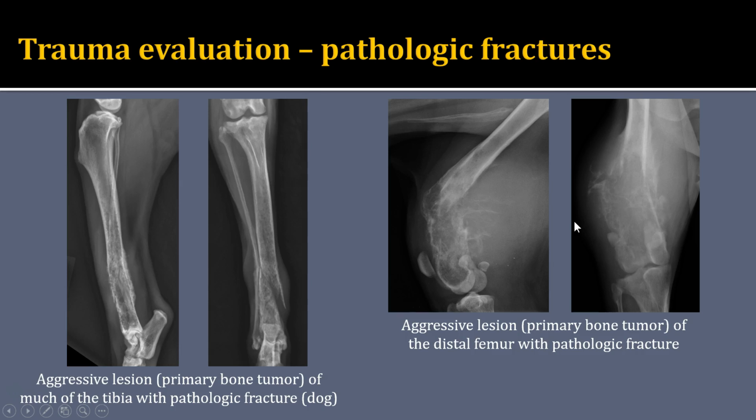When I want you to call a fracture traumatic, the underlying bone is normal, and then there was some sort of trauma that caused the fracture. But if we identify underlying bone pathology, regardless of if there was trauma, we're still going to call it a pathologic fracture. And then whenever you look at the fractures, remember to evaluate the underlying bone using the fundamentals we've already discussed.